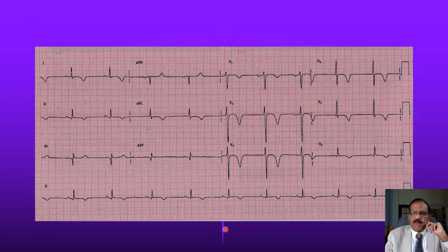Now let's do some practice. I think it's time for you to interact. Do you see any changes? I'll give you some seconds, then I will show you the changes. Maybe then you can find out. Just see if you see any changes.